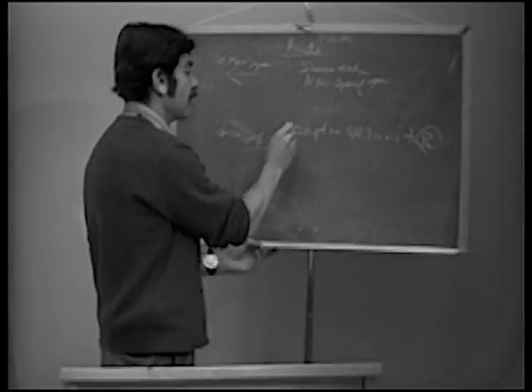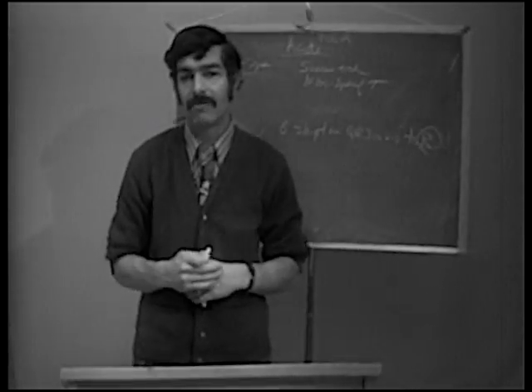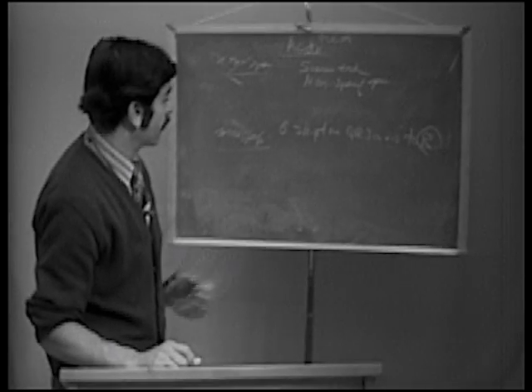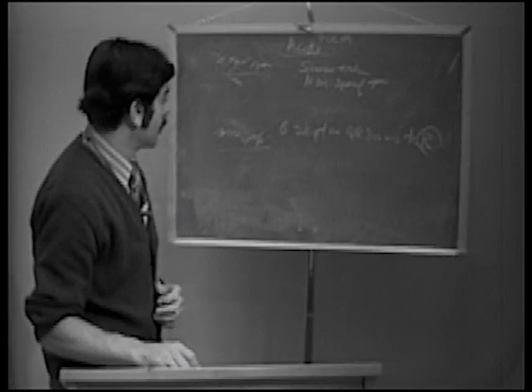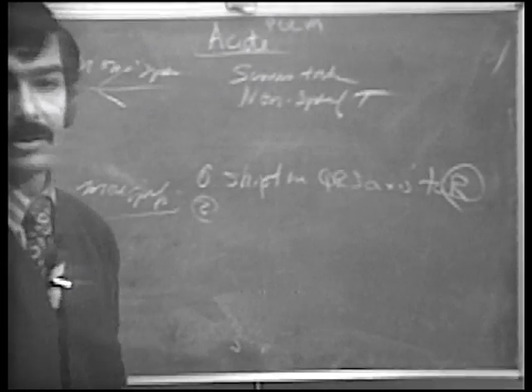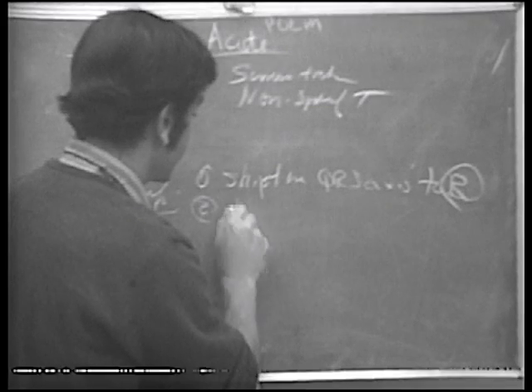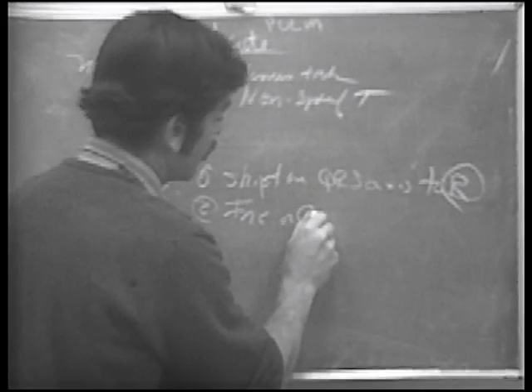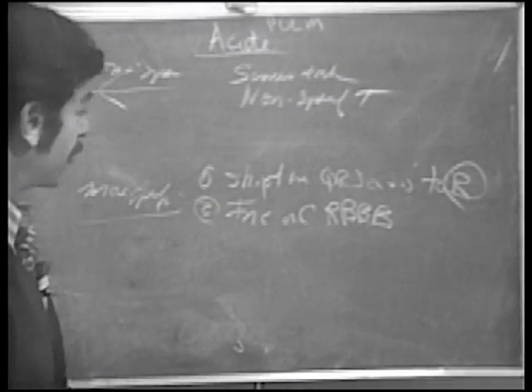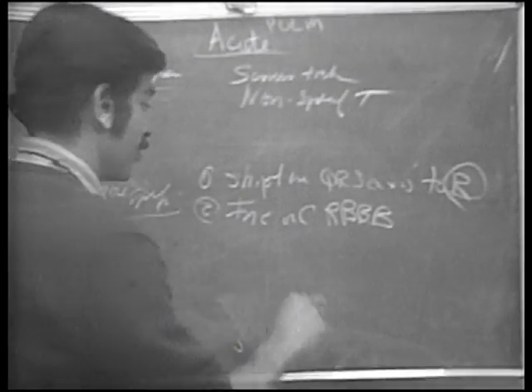That's a good sign. Okay, and in looking at acute changes, it's really very helpful if you have a previous electrocardiogram to compare with. This can be a tremendous help. Another thing that you might see is incomplete or complete right bundle branch block, the development of right bundle branch block. Again, this is particularly important if the patient didn't have it before and then suddenly develops it along with symptoms. Okay, that's another good sign.